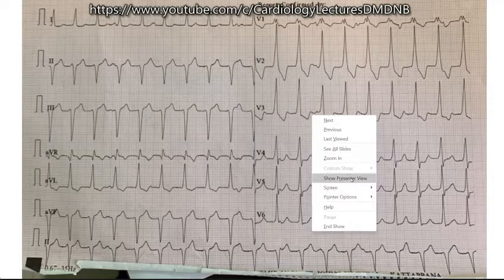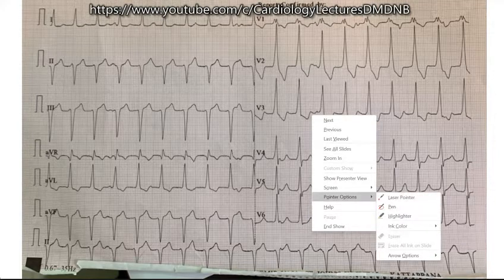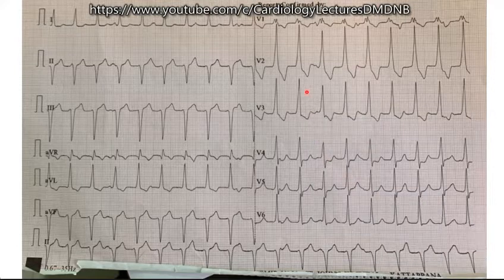So what are the electrocardiographic features of ventricular tachycardia? Sir, concordance pattern, capture beat, fusion beat, intrinsic deflection more than 40 milliseconds, and extreme right axis deviation.